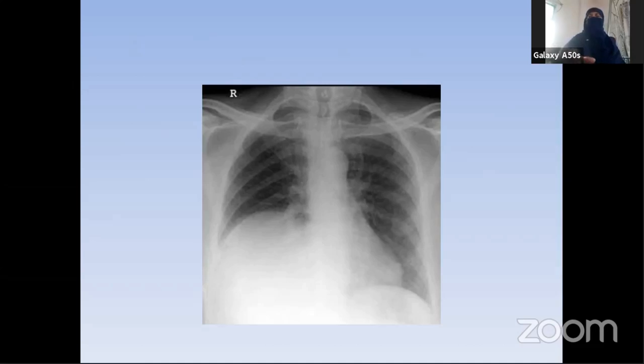And if you look carefully, these are the lung fields seen. Some bronchovascular markings are seen here. It means the subpulmonary effusion is really underneath the right hemidiaphragm, but some lung tissue anterior and posterior to the effusion is also present. So this is not at all the abdominal aspect. This is the pulmonary aspect. The lesion is at the pulmonary aspect, not the abdominal aspect. So this is not the diaphragm. If it were the diaphragm, then the lung markings should be totally elevated above the lesion. But we are seeing that some markings are running and entering into the shadow here. So this is a subpulmonary effusion.